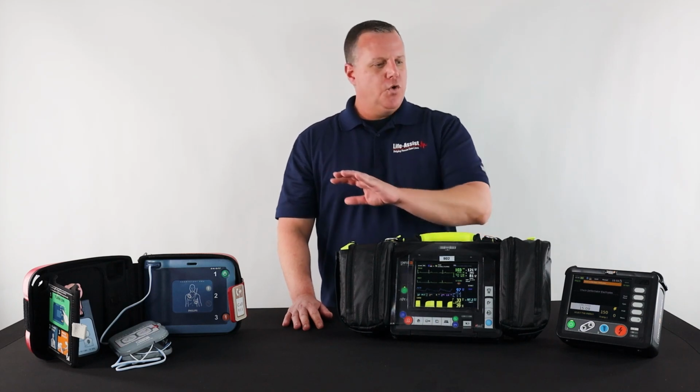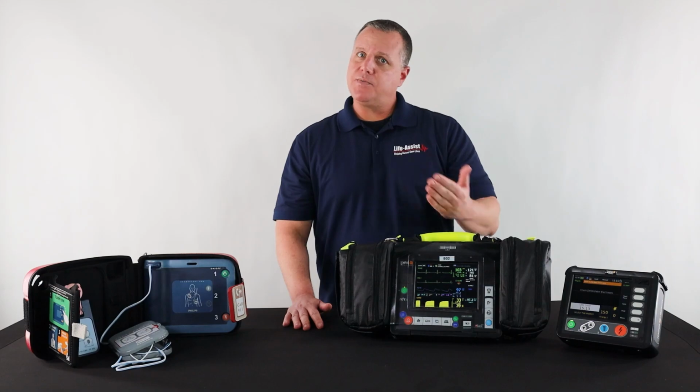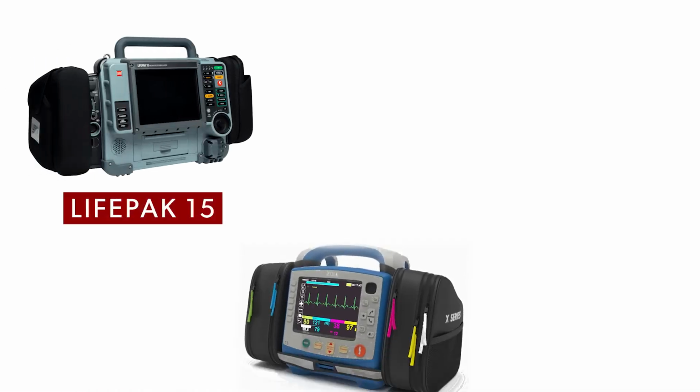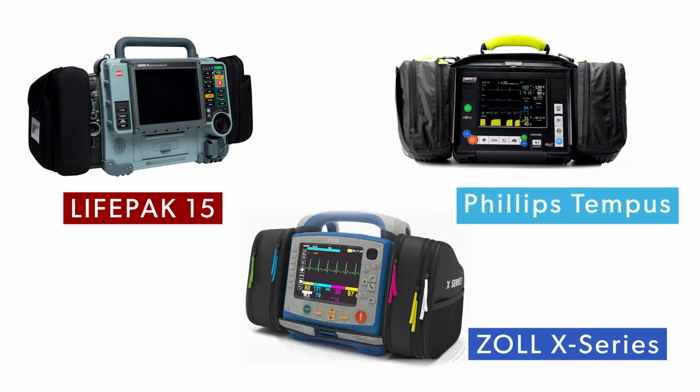Okay, so who manufactures our cardiac monitors? I call them the big three. You guys probably know them. We got the Physio LifePak, right? That's one. The Zoll series is another big player. And then there is the Philips Tempus, which is what I have in front of me today.